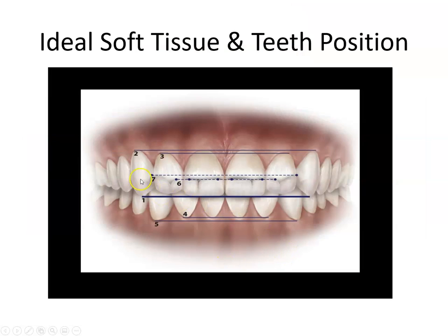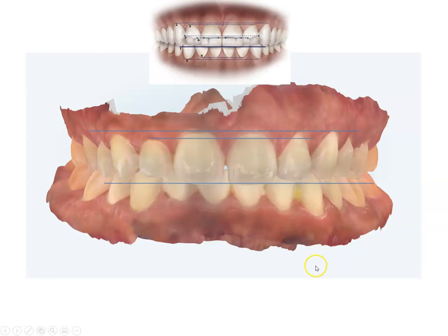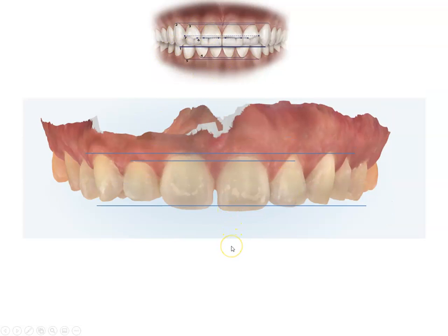Now, continuing, we did the top teeth analysis. We did number 1, we did number 2, we did number 3. Now we're going to number 4. And number 4 is how the four lower teeth, the gums, have to match. And if we look at Sandra after we evaluated lines 1, 2, and 3, we saw it with the teeth and with just the upper teeth without the lowers.